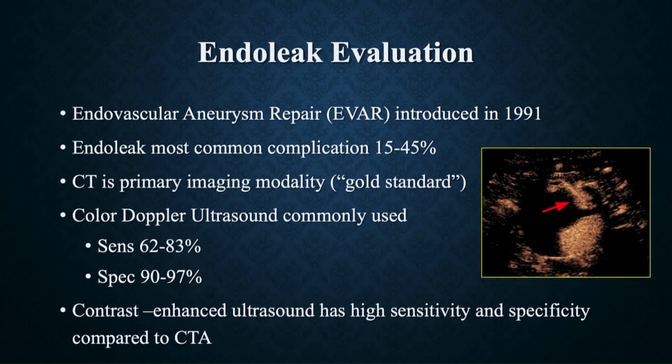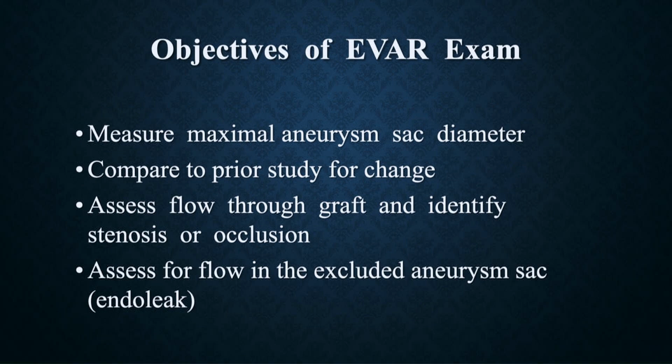It is certainly better than color Doppler alone. In my experience, because I do a lot of contrast-enhanced ultrasound, that really has become the standard for my patients because of the fact that it's very, very sensitive. Here's an example of a type 2 endoleak with the arrow pointing to blood flow coming into the sac retrograde from the inferior mesenteric artery.